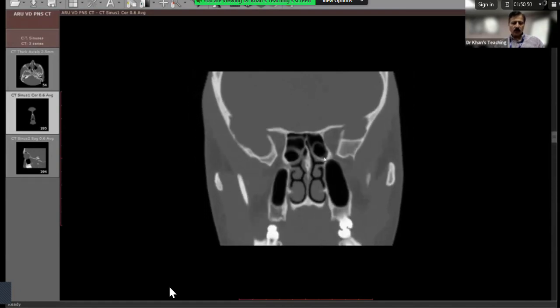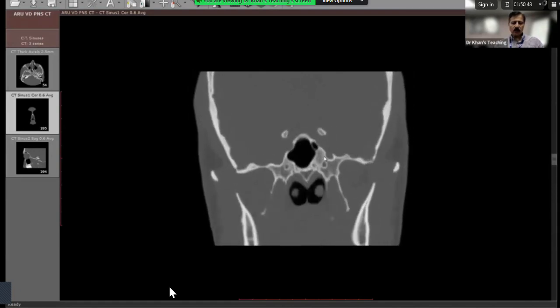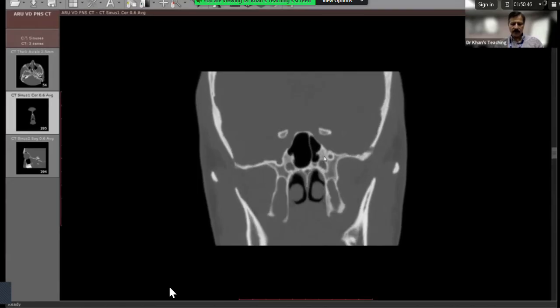So with this overview, another point which is important as far as overview is concerned is that this thing is the pterygoid process of the sphenoid, and we have got a medial and a lateral pterygoid. And this becomes exam anatomy, because they will show you cases of trauma.